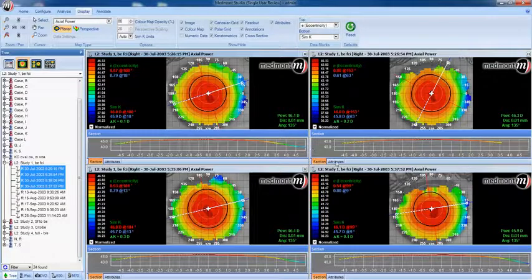Do you see any one map that looks like it should be thrown out, or multiple maps that look like they're poor? In this case, map number 4 has a fairly low upper lid that's crossing a fair deal of the upper iris, and the eyelash shadows are coming down and blocking some of the ring reflection. This gives us some false areas of flatness. 3 areas here that I think are of concern.